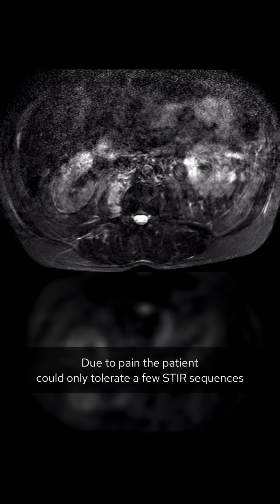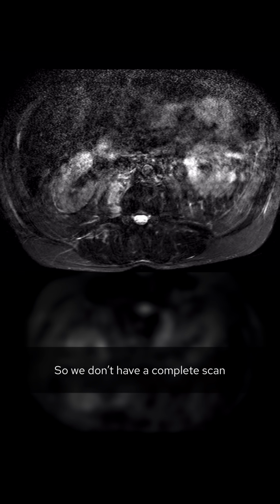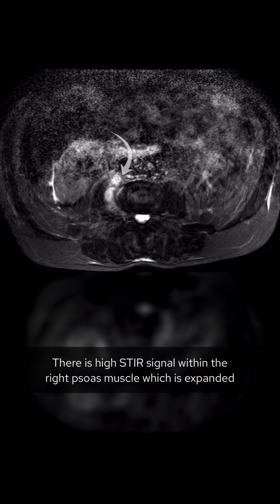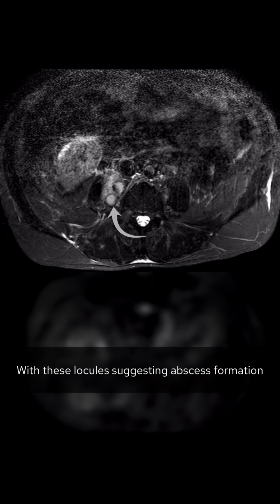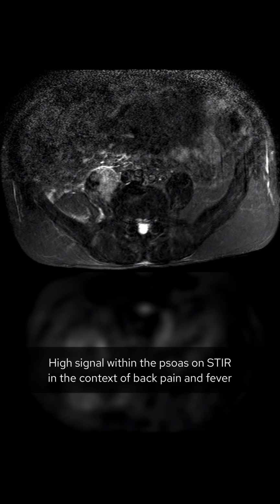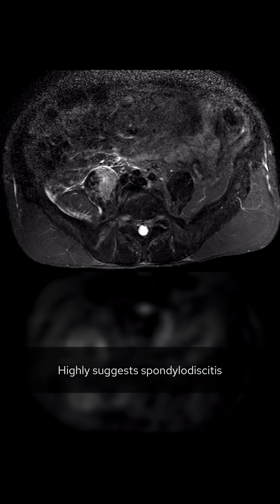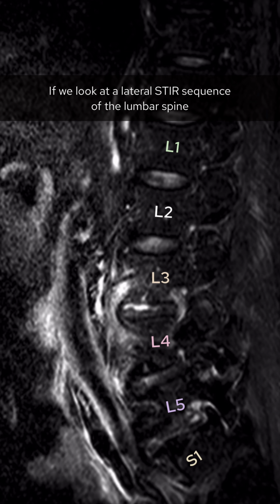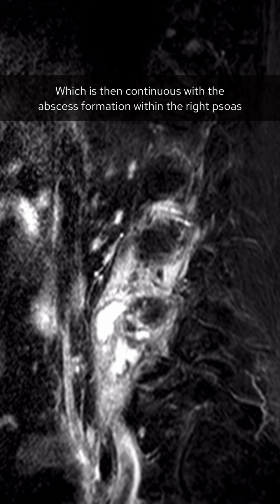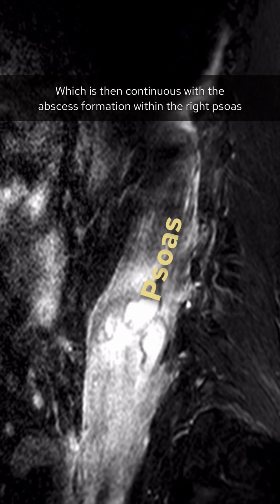Due to pain, the patient could only tolerate a few STIR sequences, so we don't have a complete scan. On this axial sequence, there is high STIR signal within the right psoas muscle which is expanded, with these locules suggesting abscess formation. High signal within the psoas on STIR in the context of back pain and fever highly suggests spondylodiscitis. If we look at a lateral STIR sequence of the lumbar spine, we can see high signal in the lateral aspect of the L3-4 disc, which is then continuous with the abscess formation within the right psoas. The findings on MRI now suggest a spondylodiscitis with secondary psoas abscess formation.